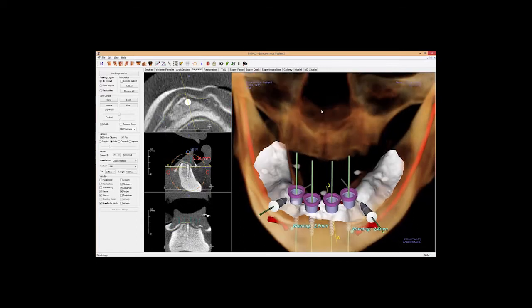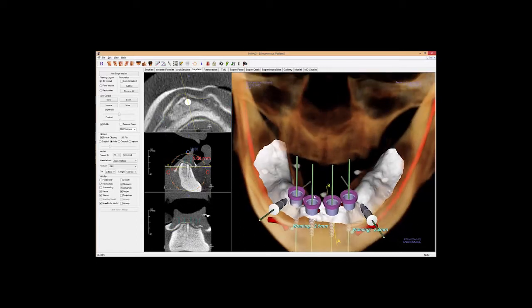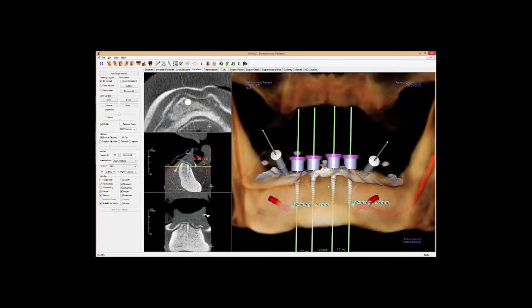We've made it pretty simple for you, so you'll just get a few pieces and you can just insert it directly into this guide, and it'll work with the existing kit that you already have for your Zest LODI system. So that way, whether you're doing it guided or not guided, there's not a whole lot of additional investment in pieces that you may not use every day. And it just keeps inventory a little bit simpler. We like that a lot.